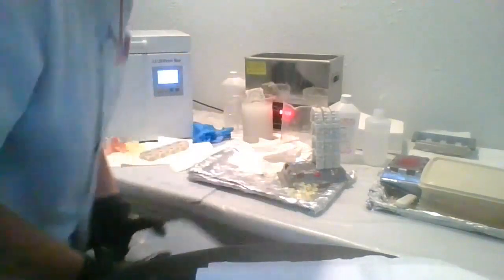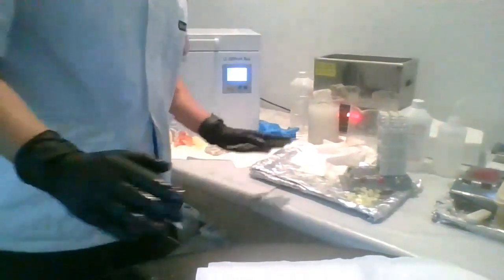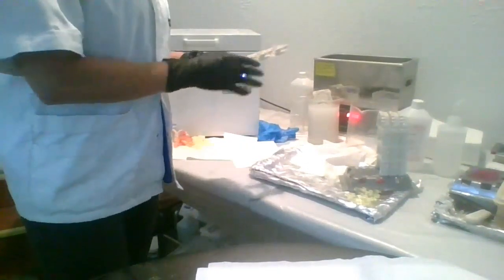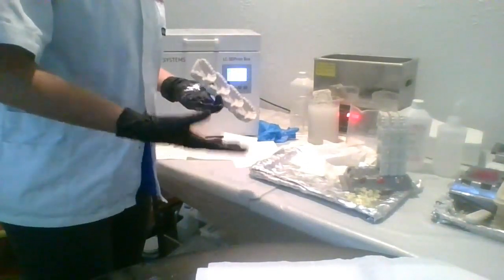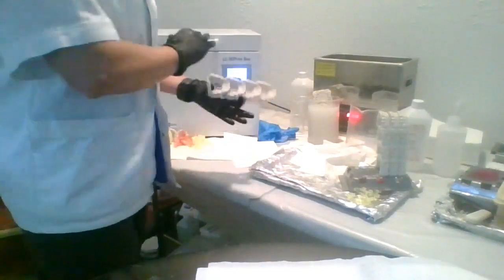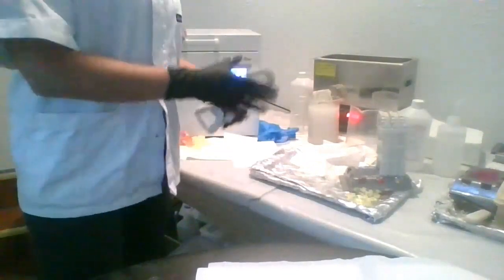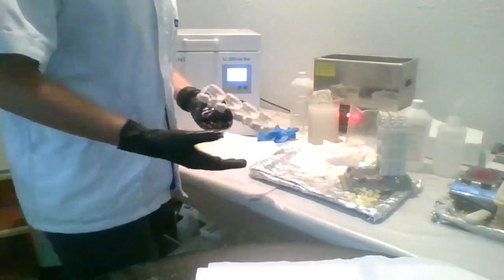Then make sure they dry completely before you put them in your cure oven. If you do not let them dry completely, the alcohol will boil into your model, into the pores, and then it'll potentially cause it to break when you're doing your thermoforming. So it's really important for any resin material, no matter what you're using, to make sure that's fully evaporated, or else you'll have problems with strength and stability later on.